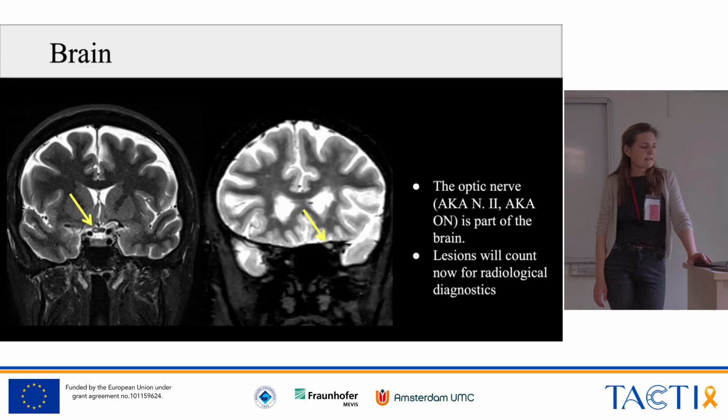And finally, bear in mind that the optic nerve is coming up also as a fifth lesion. And those optic nerve lesions are a lot more difficult to diagnose if you do not have orbita sequences. That's also a problem. So for the orbit, we classically want very thin, 2 or 3 millimeter thick coronal images in STIR or, I don't know, Dixon sequences, that show us the optic nerve nicely. Very often we only have 3D FLAIR, and there's just no real fat suppression, and you have a lot more artifacts in the orbit. So it's more difficult to identify optic nerve lesions.